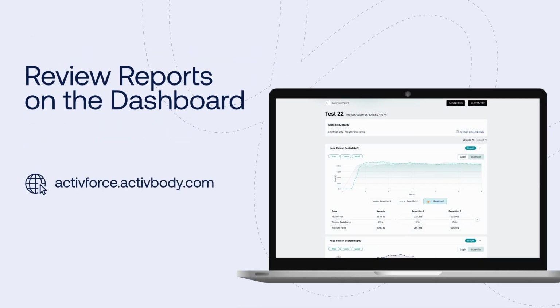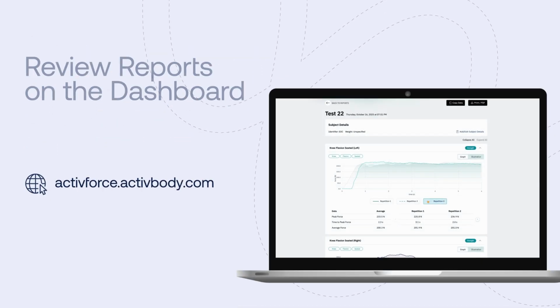Repeatable testing delivers the most reliable insight, helping you track performance and plan progression with precision.